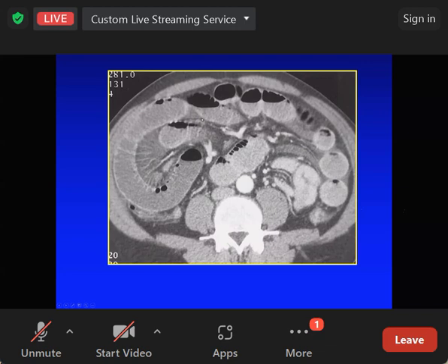Dilated bowel, this is small bowel, central-ish appearance, and you can tell it's small bowel because there is collapsed ascending colon, and here's collapsed descending colon. Small bowel obstruction from inguinal hernia.